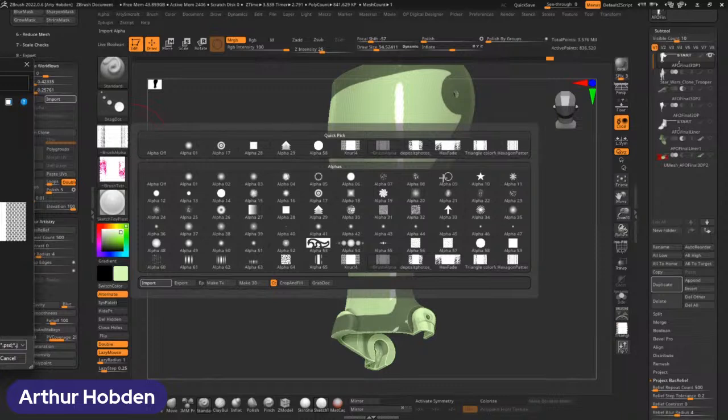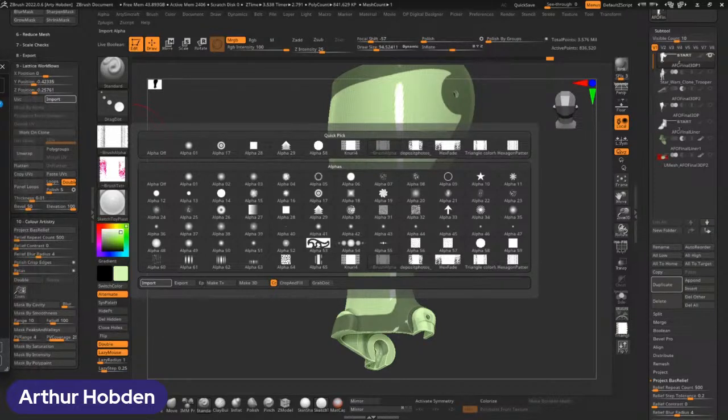Damn. Anyway, let me just say that you can change them by changing the proportions of the design on the 2D image. So if your logo is coming in too wide, if you shrink it on the 2D image and try it again, you can scale it that way. If your hex grid isn't hexagonal, it's more stretched, you can change the proportions of the 2D image, save out a new version, and then try rewrapping it again.